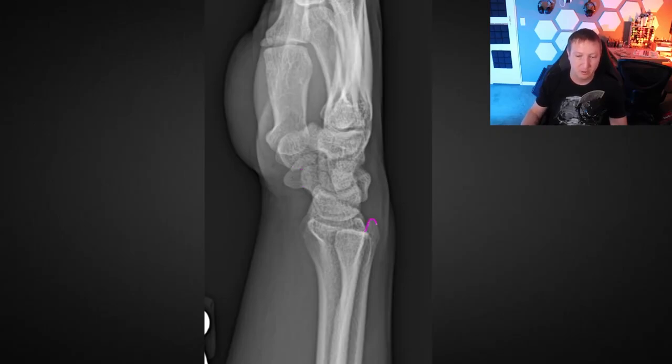Usually we'll see the ulnar styloid process projected a bit more posteriorly here, and again, that can depend on their wrist positioning. The radial styloid up over here, and then again, it's sloped downwards, and so we see the edge of the sigmoid notch down here like this. The capitate, oftentimes we'll see a little bump back here, and potentially that can have even an ossicle, a carpal boss, a dorsal prominence, and we'll see that sometimes make a joint with the base of the third metacarpal.